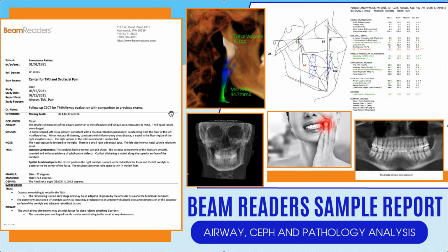There's a spur. Again, this is not dental stuff, except for whenever you take a full CBCT, you are legally responsible for interpreting it. So if you don't know how to do it yourself, you have to send it to someone who does. I went over the pricing in the previous Beam Readers content that I made. So if you want to watch the previous video first, you can just go to my YouTube channel, which is Straightsmile Solutions, and you can search by keyword Beam Readers and it should come up.